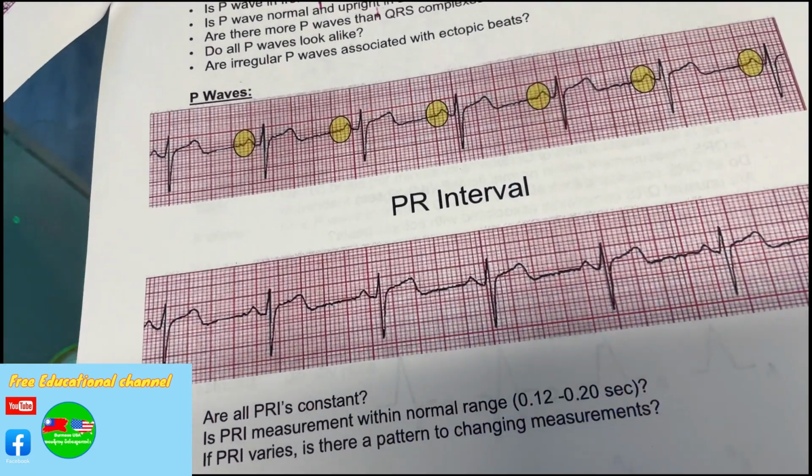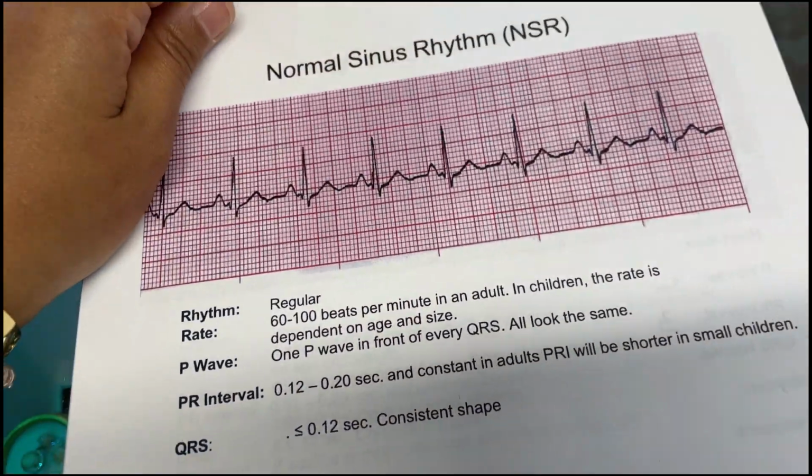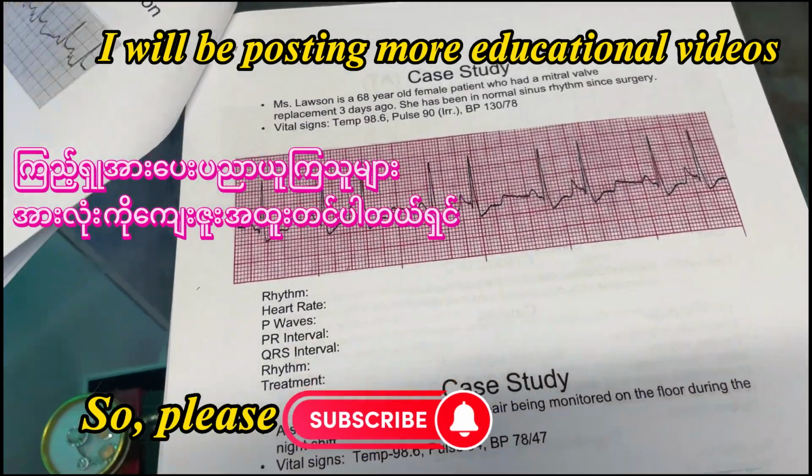Okay, so we're going to do more about normal sinus rhythms, and we're going to practice together with Brady, Tachy, AFib, VFib, VTach, all sorts of stuff with case studies.